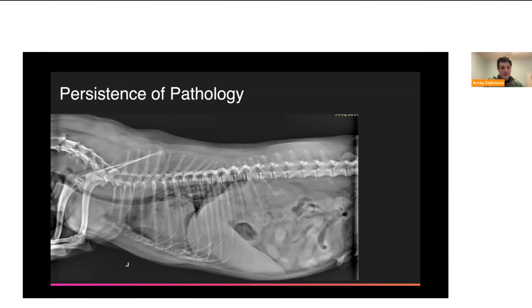A lot of people worried about tracheal collapse, given it's a Yorkie. Well, this trachea looks pretty good. There is a little soft tissue band superimposed with like the dorsal third of the trachea, but you can see the dorsal margin above it. So that's not tracheal collapse. That's either going to be a superimposed esophagus or that's going to be a redundant dorsal tracheal membrane. That's not tracheal collapse. What this dog does have is carinal and mainstem bronchial collapse.